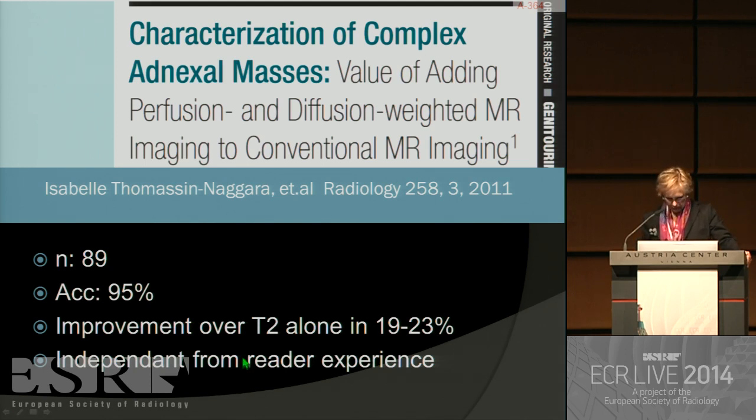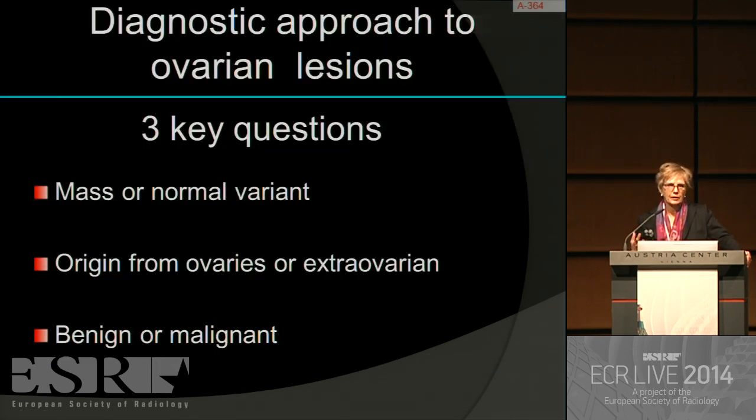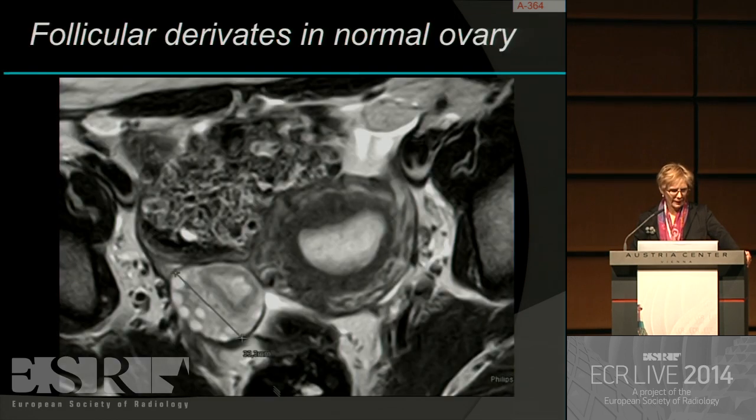But before I go into detail, I will start with the very basics. So whenever we have an adnexal mass, these three questions should be answered. Is it really a mass? Is its origin the ovaries? And what's the dignity? So let us start with normal variants.